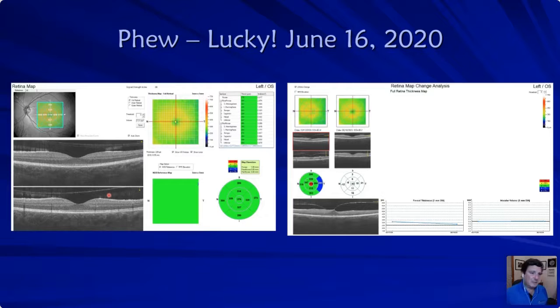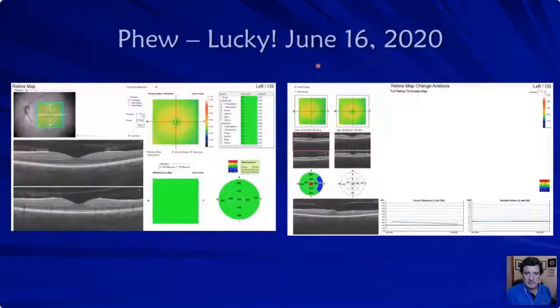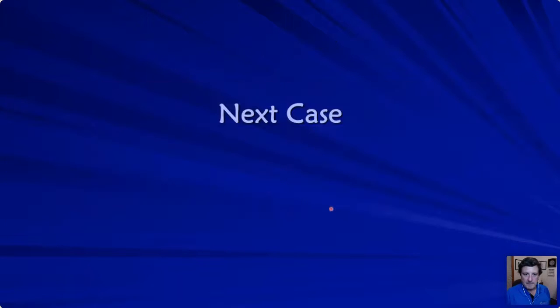I would expect these to be a lot older. This is March 17th, 2020, this year, right? COVID, right? I mean, first day of COVID, maybe, and in Pennsylvania here, it was all kind of hitting. And so I just said to her to come back a couple months later, and she did. And luckily it released. So that was a fun case to have.